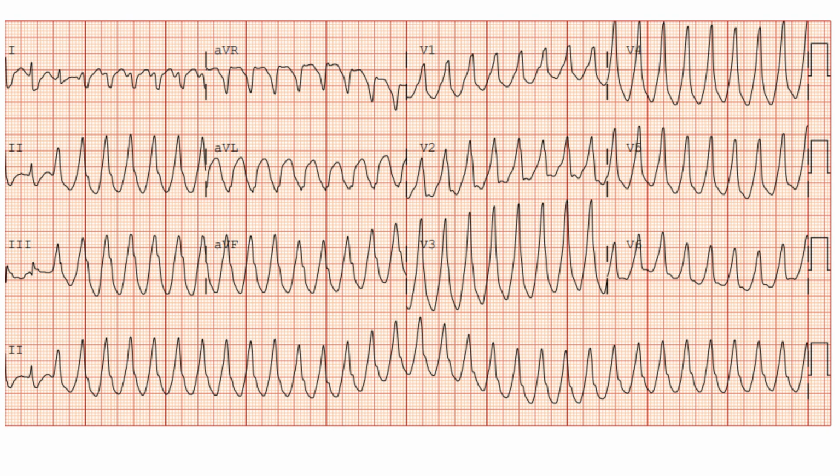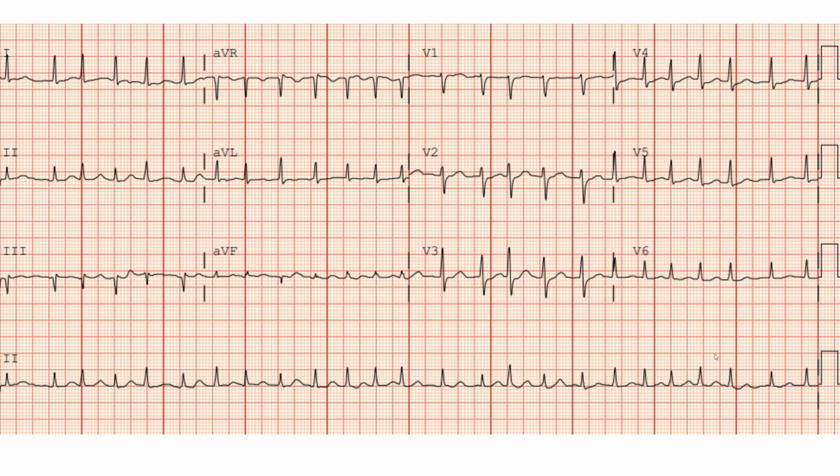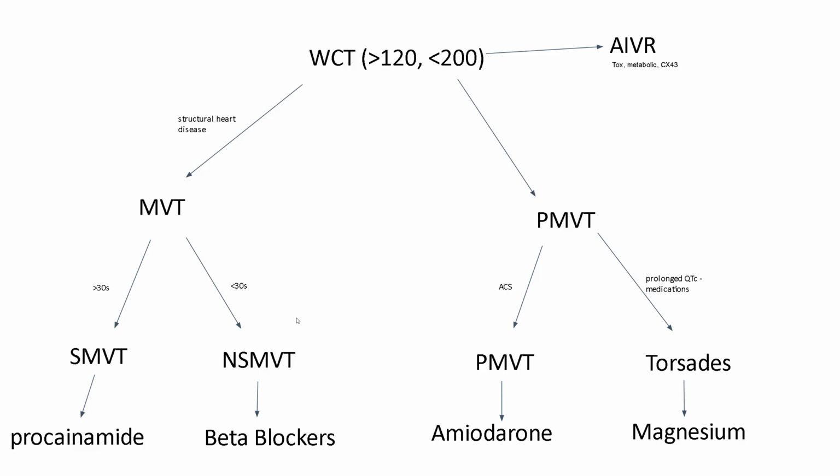But again, this gentleman's pre-test probability was high, right? He's an older gentleman with a history of a myocardial infarction. And let's see if we can find, well, we do, okay? So the other thing on this EKG, if you look pretty closely, especially on these beats right here down in AVF, you can see there is a fractionated QRS, right? Like there's a delay in the QRS, like a blip in the QRS, but it's less than 120, so there's something electricity has to go around. Again, most likely for this gentleman, scar-mediated ventricular tachycardia.